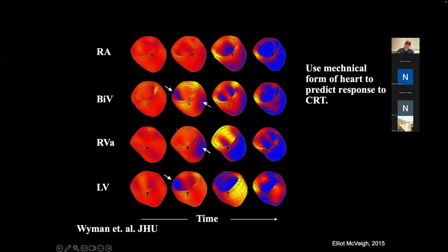And at this time, the heart has been paced, and this blue color is the shortening. What we're mapping here as a color is the myocardial shortening at that local location, so the circumferential shortening. So you can see there's a volume around that pacing lead at which that shortening has begun to occur. It hasn't begun over here. We don't see it over here, right? This side nothing has happened yet.